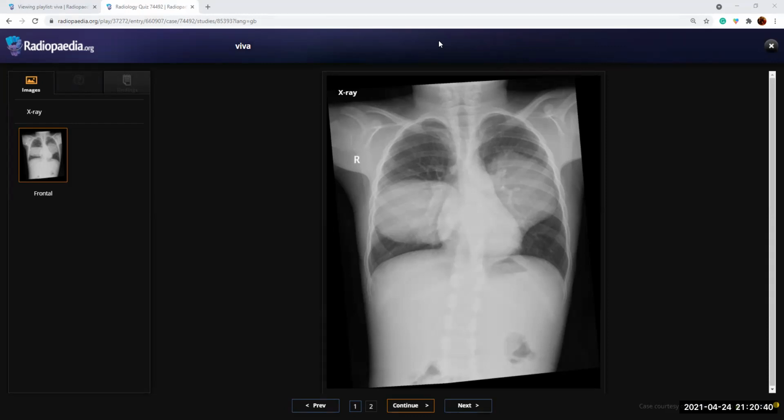Anterior or middle mediastinum is also a possibility, but if there's a lateral view, I could correlate. No, we don't have a lateral view. But on the left side lesion, I can understand it can be a bit confusing, but the right side lesion has acute angles with the mediastinum. And I can see the hilum overlay sign also, and the cardiac borders are seen. Okay, you still think it's mediastinum? You want to continue?